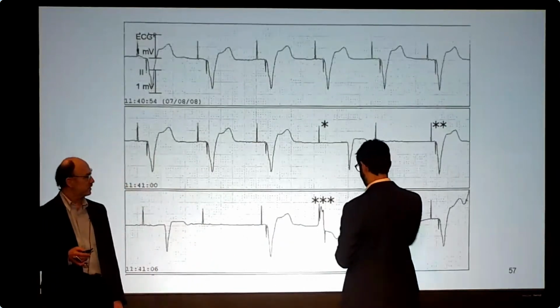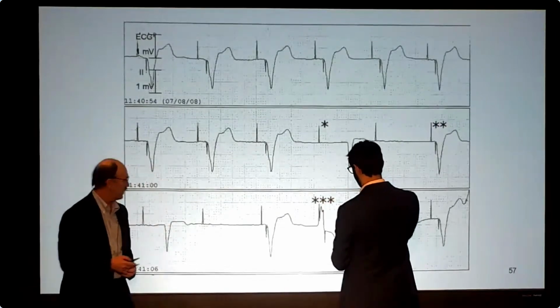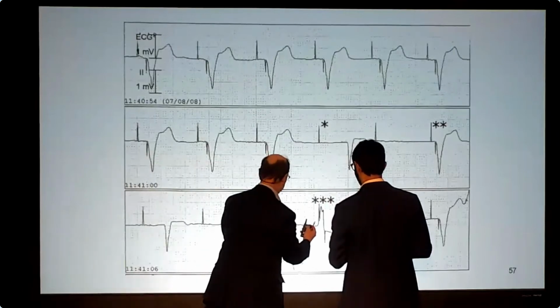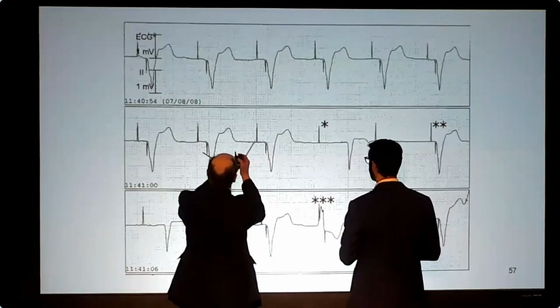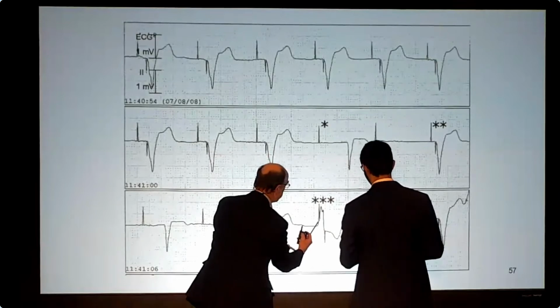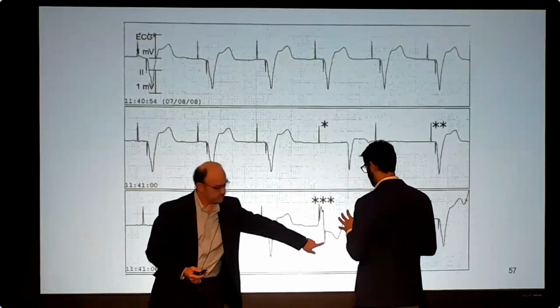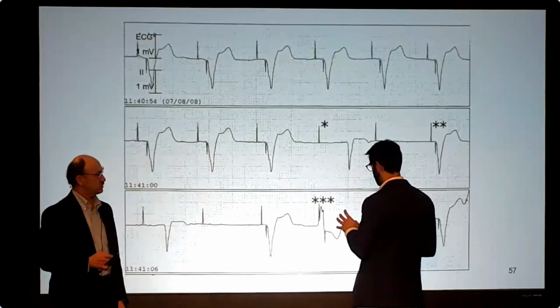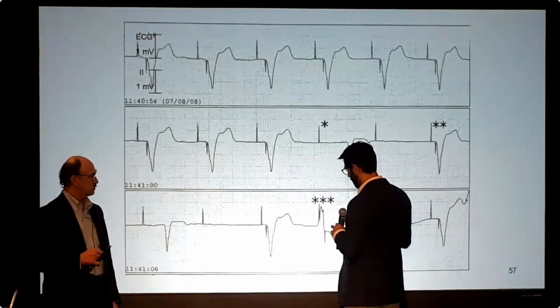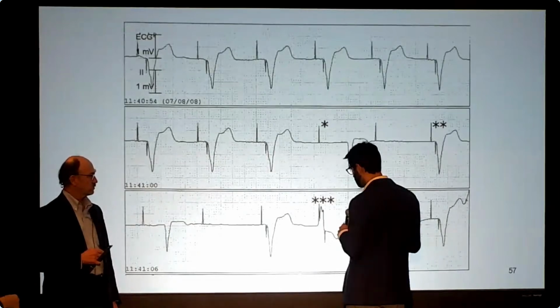My eye calipers tell me that the A pacing is on time and regular at the lower rate limit, the VA escape interval. You can just do that. Here's your VA escape interval. Pretty close. Yep. So then that's an atrial spike here. A couple of things might have happened in my mind. Either the atrial lead fell into the ventricle and paced the ventricle, which is very unlikely. The atrium doesn't see that, paces the atrium anyways, probably captures.